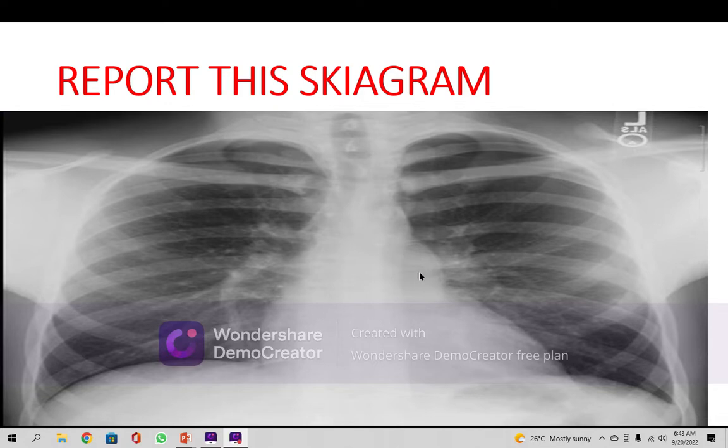It should be diagnosed, or rather confirmed, by echocardiography. What is the pressure here? Because the kyphoscoliosis will definitely cause burden on the right ventricle also. So other studies should be needed. But what is seen in the X-ray, you should report it.